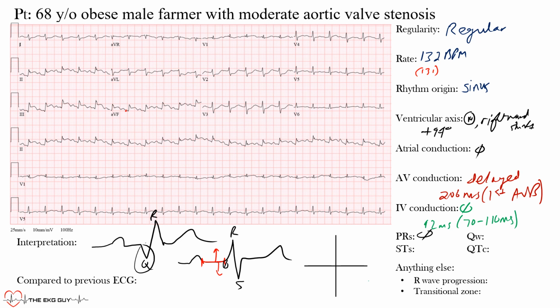The leads where we can see Q waves developing are lead 3, where you can see these small ones, lead 2, and maybe aVF. Those are the main ones that we can see. Oops, wrong spot, let's just erase this. We mentioned leads 2, 3, and aVF. 2 is here, aVF is here, 3 is here. Remember, these are the inferior limb leads.